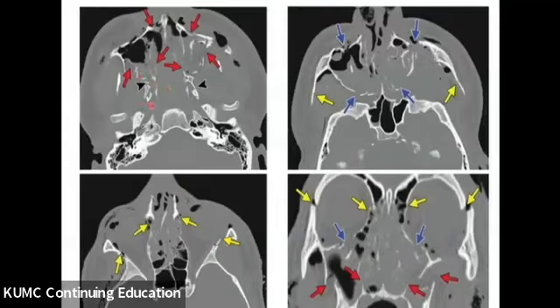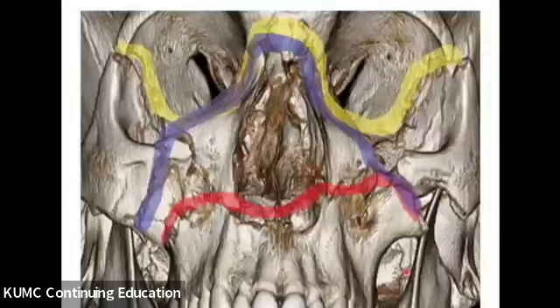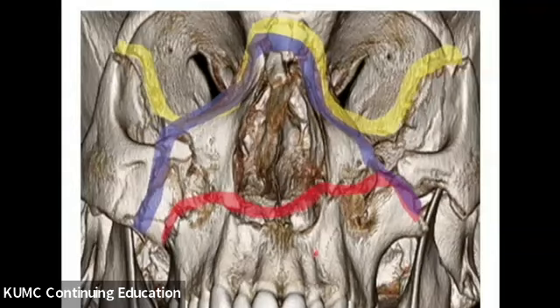So here you can see that there's pterygoid plate fractures, which we need for our Lefort classification. And then you have fractures of the anterior and the posterior lateral maxillary sinus walls, as well as the medial sinus walls, which you see right here. So that medial wall involvement is going to define your Lefort 1. So red is going to be your Lefort 1 on the 3D rendering.